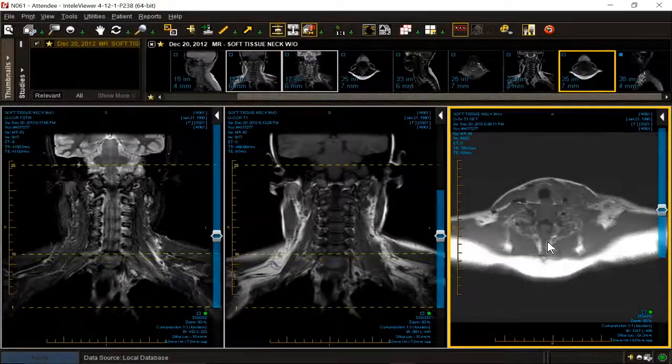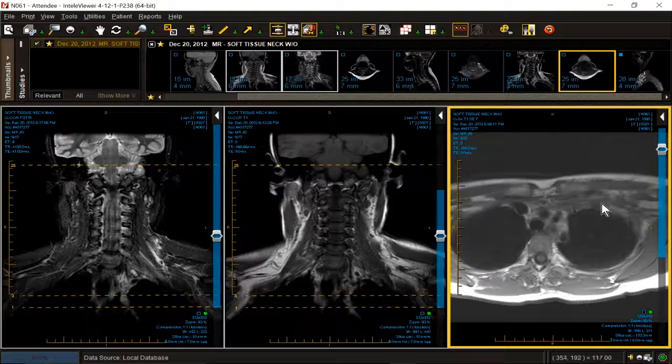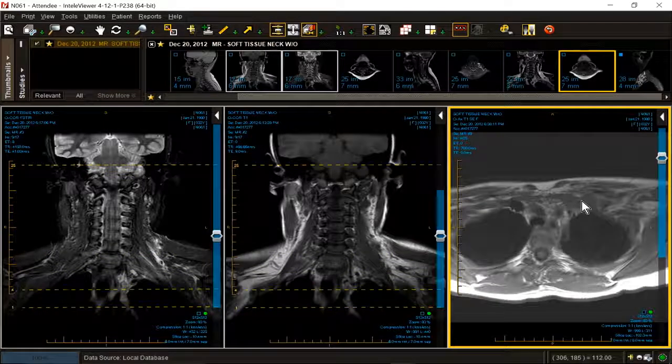Let's start out with something easy that we're all comfortable with, the axial. On the right-hand side, we have a carotid artery and a jugular vein. On the left-hand side, we have a carotid artery and a globular, gray, smooth, homogeneous, almost solid-looking replacement of the left jugular vein. I say we go south, we go inferior, caudad, and we see the subclavian vein. We go back up to the jugular vein, subclavian vein. So we've got a patient with subclavian vein thrombosis.